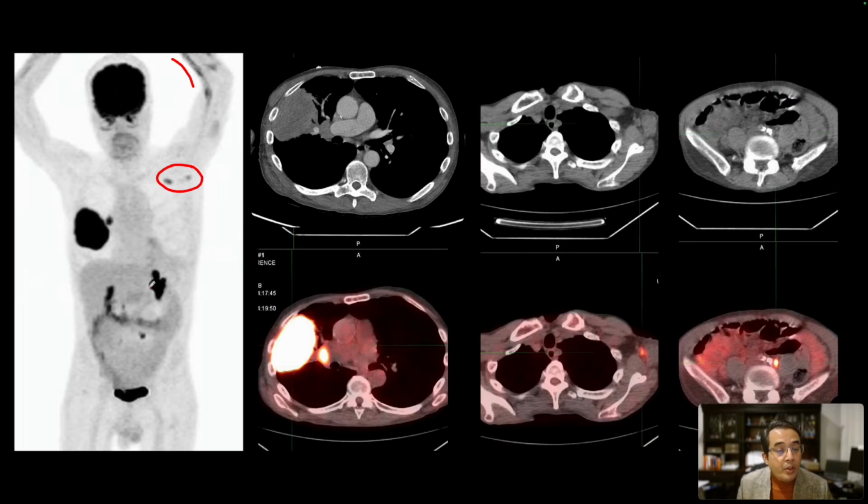Also, as the urine is coming down the ureters to go into the bladder, frequently there is some stasis seen in the ureter, and that can be FDG avid as seen here. And so these are two foci of benign uptake in this patient with lung cancer.